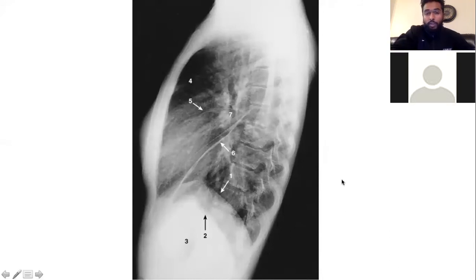The way you measure the oblique fissure is, you go from T4 or T5 and draw a line anteriorly. This is very dramatized, but these are the fissures. So if you draw a line from T4 or T5 to the anterior third of the diaphragm, that's your oblique fissure. And if you draw a line from the hilum straight forward, that's your horizontal fissure. You're gonna see how this comes into effect. I'm gonna go to a few slides where you have to localize a lesion, and you'll see.